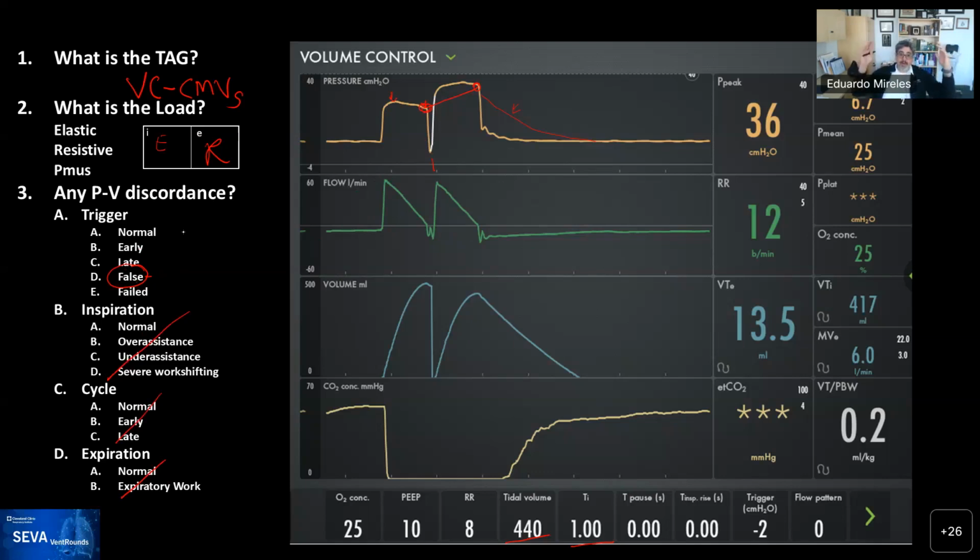So now you are in front of this, and you say, why is this happening? And it's time for me to give you a little bit of background on this patient. This patient has a tracheostomy long-term for a failure to wean, and had the trach dislodged because of agitation.